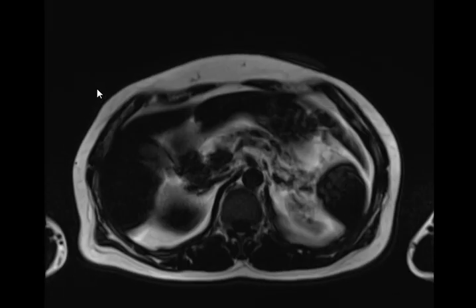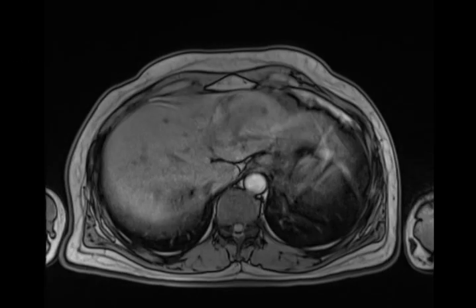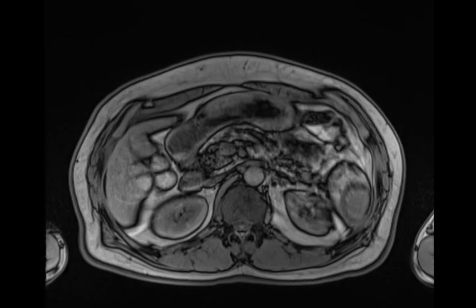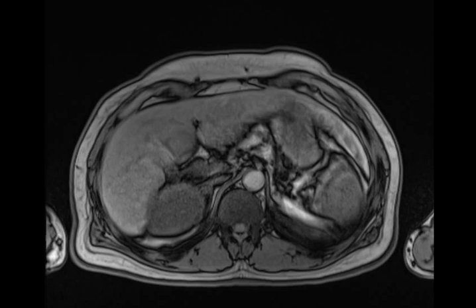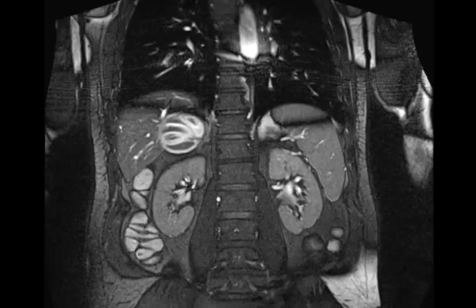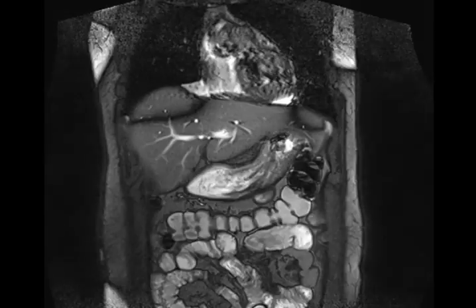Why does the wall enhance? Can anyone tell me? The cyst, it's a parasite. Why does the wall take enhancement and the cyst doesn't? Inflammatory reaction. Why does it cause inflammation? Why does the wall of a hydatid cyst usually enhance? The content does not enhance. Okay, understood, but why does the wall enhance?